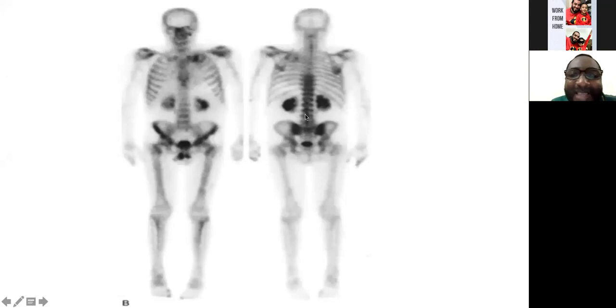But one of the things I want to highlight here is that if you look at the spine, you can visualize the entire spine. But when it comes to the upper part, you can't see the spine. Can you see? No. Yeah, there are differences. Right? You can see the entire spine, but at this level, you are not properly seeing the other spine.